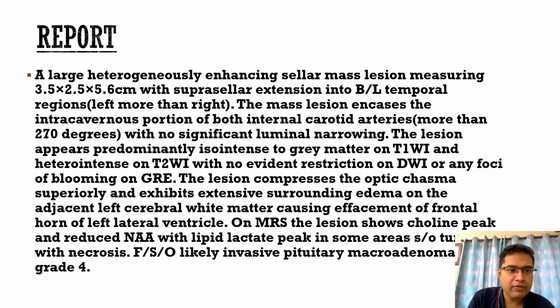So this is the report that I had given: there was a large heterogeneously enhancing sellar mass lesion with suprasellar extension into bilateral temporal regions, with extension to the left temporal region more than the right. The mass lesion encased the intracavernous portion of bilateral internal carotid arteries measuring more than 270 degrees with no significant luminal narrowing, which suggests cavernous sinus invasion.